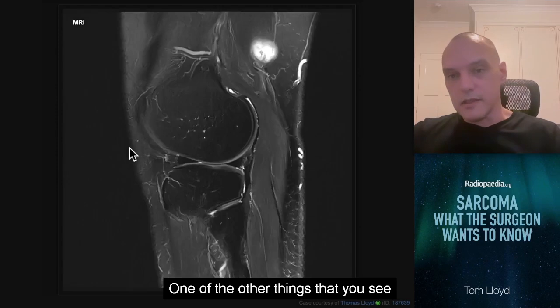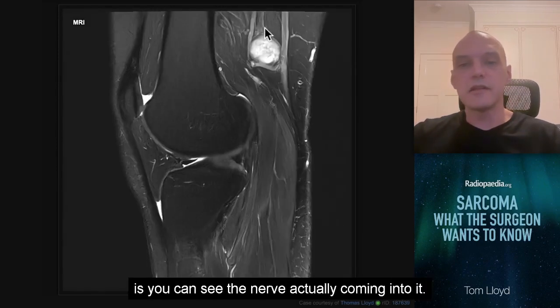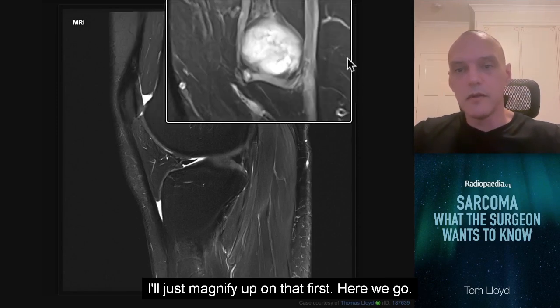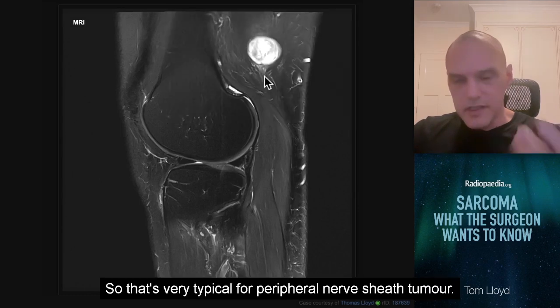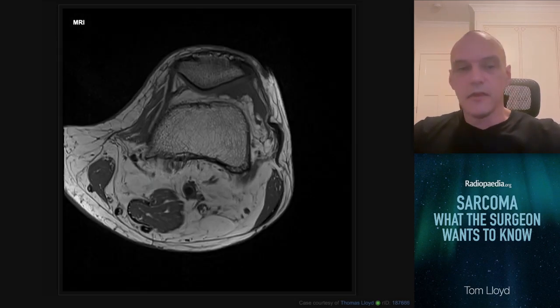One of the other things that you see with peripheral nerve sheath tumours, and this case shows it quite nicely, is you can see the nerve actually coming into it. I'll just magnify up on that for us. Here we go. You can see the nerve coming in at one end and then out at the other end. So that's very typical for a peripheral nerve sheath tumour. You could diagnose that with a high degree of confidence.